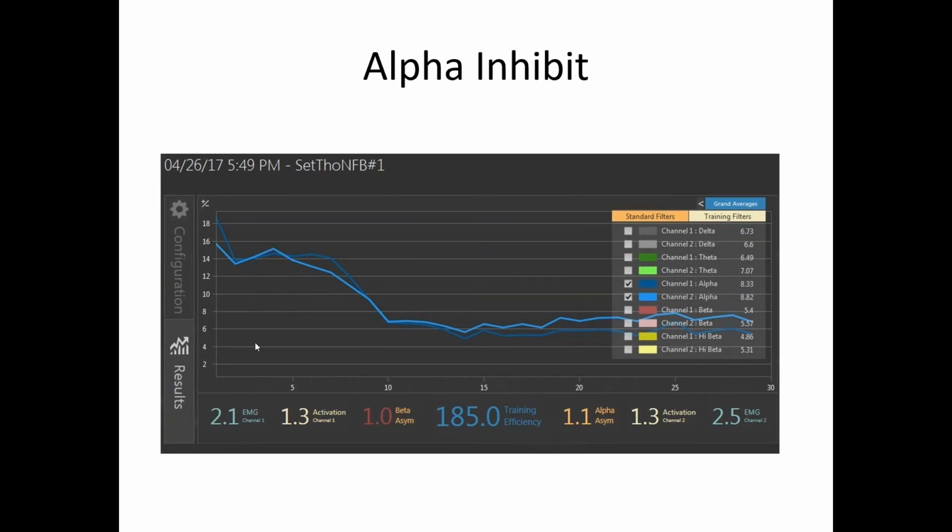Well, Richard, there's a point that I'd like to hear you talk about that might be interesting when you're thinking about just focusing on one, but from the whole perspective. You see trend screens where, if you're looking at, say, eyes open, and you're supposed to be training whatever protocol, your delta should be dominant, followed by your theta, then your alpha, and so forth, the layering piece. But what you see is that even though it's a low power map, the alpha might be up in the normal range based on where it should be, but relatively speaking, it's higher than the other two brainwaves, the delta and the theta.